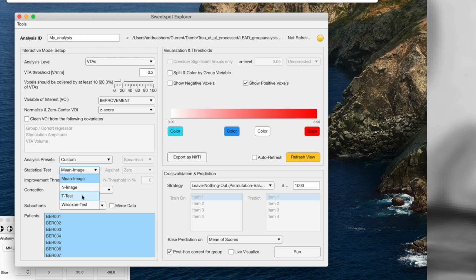More interesting, I would say, is a t-test or then Wilcoxon test. Again, I can only advise you to read up the literature by Till Dembeck, especially the preprint I've just shown you, to get more information on advantages and disadvantages. But for now, maybe let's use the t-test. And now the question is, against what do we test, right?